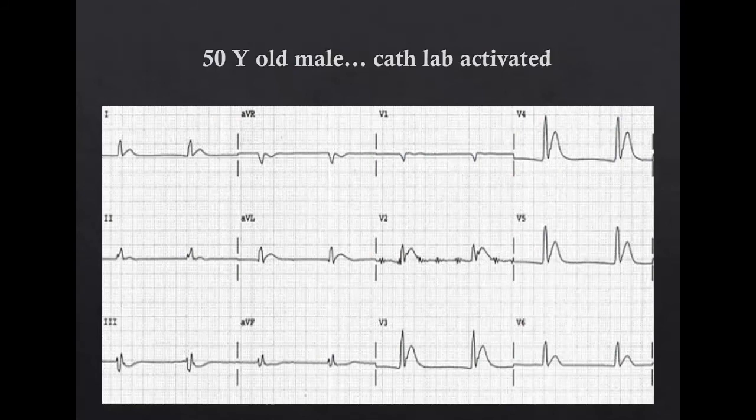All right. So this was another exciting case. All right. ECGs are just beautiful. All right. So this was a 50-year-old male patient who came to our emergency department. He had lung cancer and he had some pain. And the chaps got excited and then they activated the cath lab. Do you guys think they should have activated the cath lab here? Green or red? Red or green? All right, I see the majority no cath lab. Can you tell me why? Anybody?